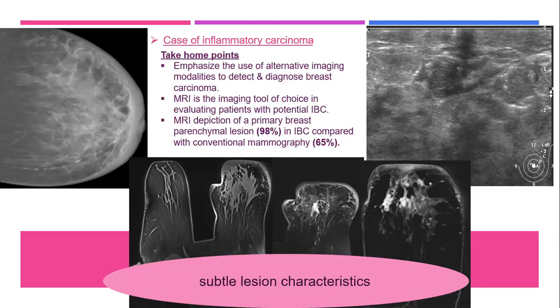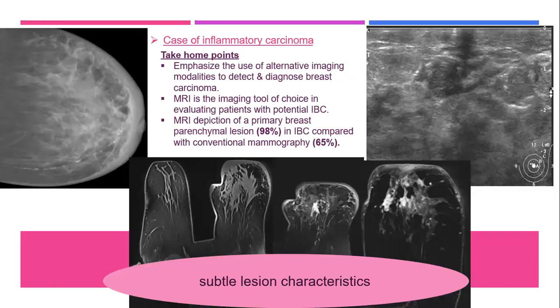It is multifocal clump enhancement, meaning the distribution is multifocal, and the internal structure is clump enhancement. So he's going with suspicious abnormality. Okay, take this, Abir.